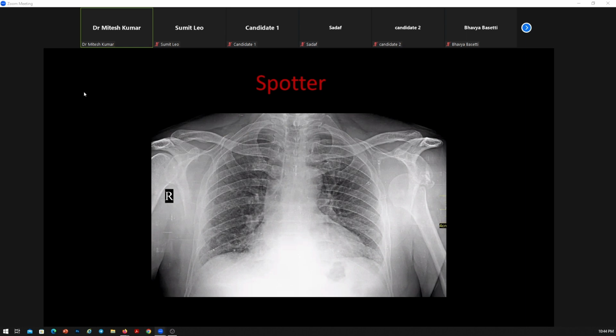Okay, so fine. We have the first response coming. Dr. Sandeep, please keep a look at the chat box. Yes. So I'll also inform you, if you allow me, about what people are answering. So Dr. Rafiq has said subcoracoid anterior dislocation. Dr. Rafiq, you did say subcoracoid anterior dislocation, but which side? You have to mention the side as well, right? Then there's left anterior shoulder dislocation, left anterior dislocation with Bankart. So anterior dislocation of the left side seems to be the common answer.